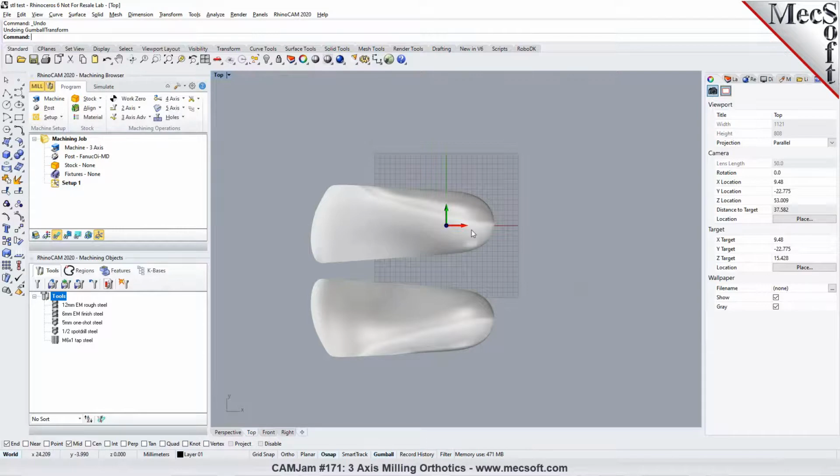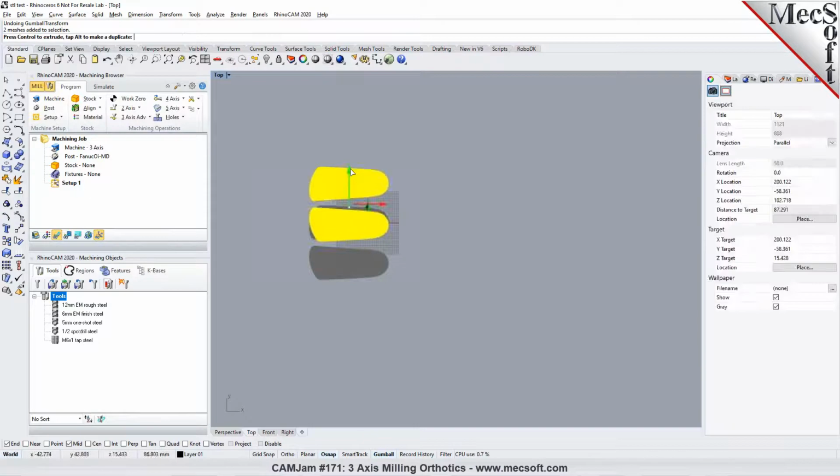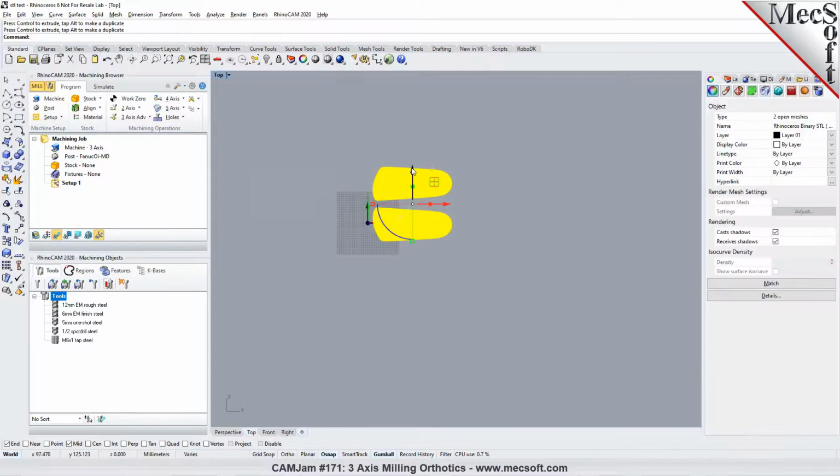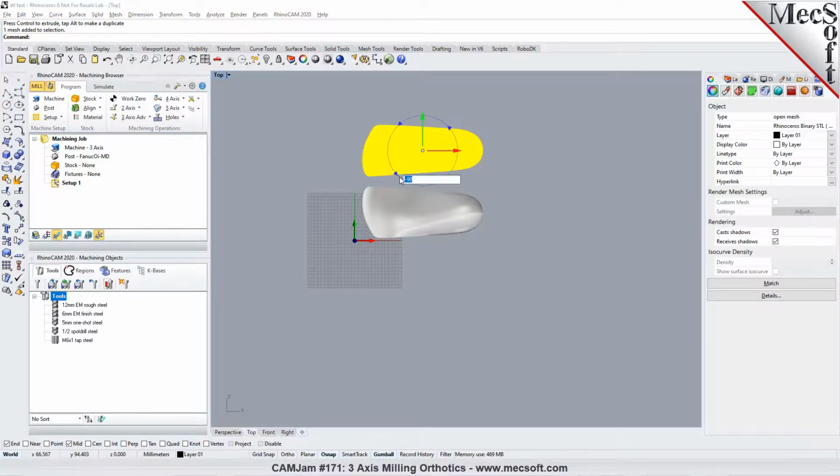Okay. So normally each foot scan is separate. Would we be able to reposition each orthotic? Absolutely. You can use the tools in here to drag and drop it however you want. But not just, let's say, right versus left. Could we put the heel on the other side on just one?